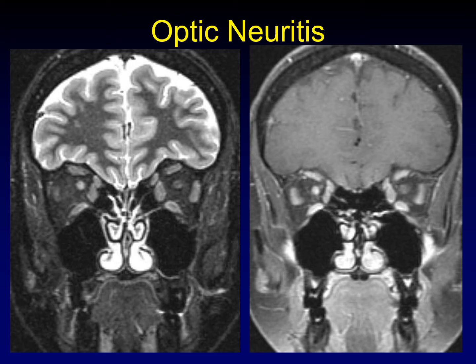So here's a patient with a clear asymmetry within the orbits. On this side, the optic nerve sheath complex is bright on T2, and on this side, it's got our target sign. There's a clear asymmetry where the optic nerve looks a lot like the extraocular muscles on the right, and it fades into the background on the left. So you've got to know which of these is normal.